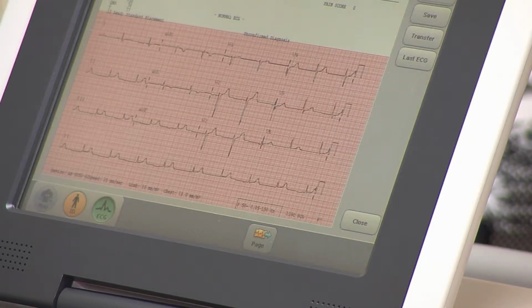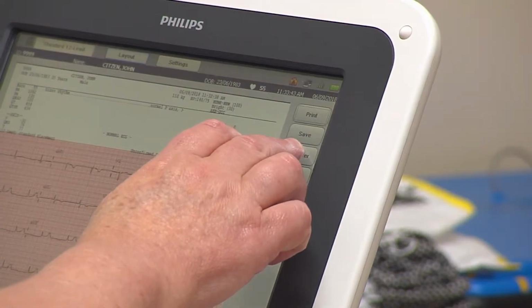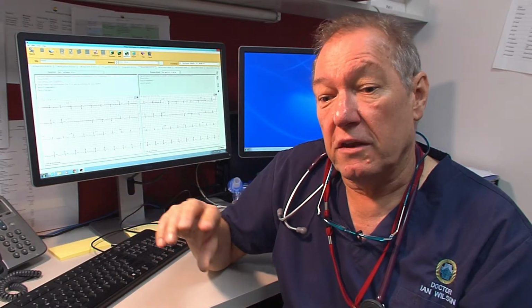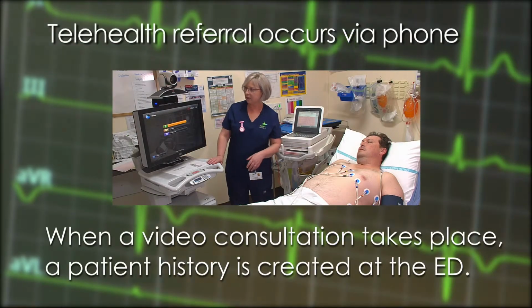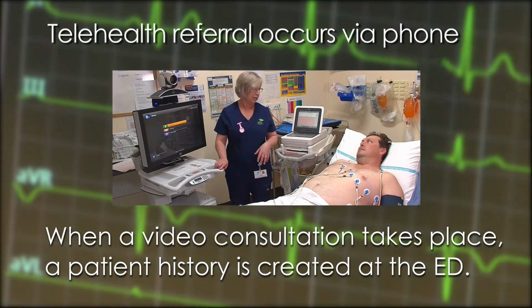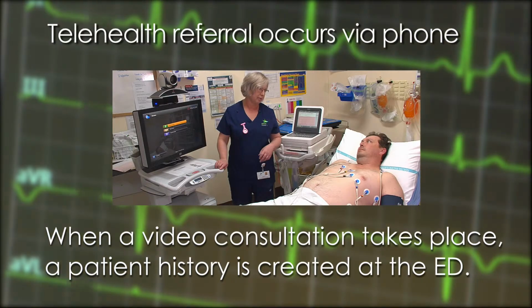When you look at the digital ECG system, there are a couple of things that you're looking for. You're thinking, can we manage this patient up there locally? If I have a look at the ECG, talk to the doctor, and then keep the patient there, there's nothing that is a red flag that they need to be brought down. The other possibility is that you've got a patient and you think, gee, there's something worrying about this. There's something worrying about the ECG, there's something worrying about the patient. You may decide you're going to do a telehealth consult and say, no, this patient looks too sick. A whole range of things that would say, I need to transfer this patient down to Wangaratta.